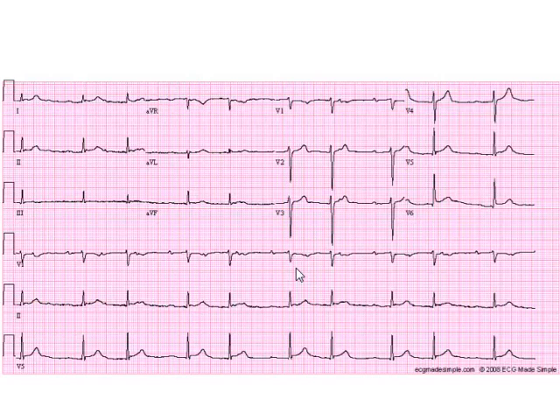Finishing the rest of the ECG interpretation, we see that there is no evidence of left or right atrial enlargement. The QRS axis is positive in lead 1 and positive in AVF, suggesting a leftward inferior axis, which is normal. Because the QRS complex is narrow and sharp, there is no evidence of any intraventricular conduction delay. The voltage of the QRS in the limb leads and the precordial leads is normal with a normal axis, and thus there is no left or right ventricular hypertrophy.